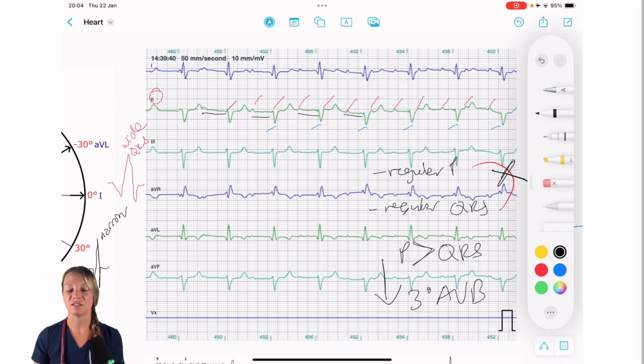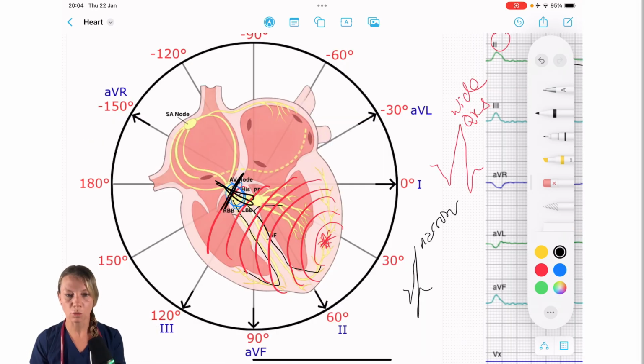Complete heart block in cats is usually not transient, and the most common mechanism is degeneration and fibrous replacement of the AV conduction system. This is what prevents all sinus impulses from reaching the ventricles. This is a structural interruption of conduction. Once present, atrioventricular synchrony can't be restored electrically. The ventricles are permanently reliant on an escape rhythm.